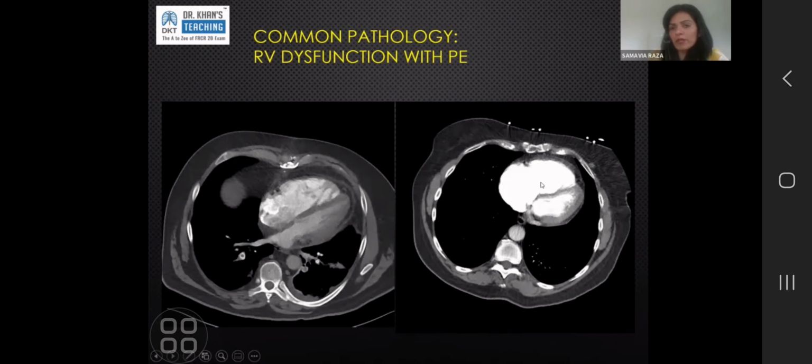Context is important about whether you can see a cause for that strain. That could be a chronic, CTEPH sort of situation, or it could be an acute pathology. If it's an acute pathology causing that much movement of the interventricular septum, it is life-threatening. It certainly warrants a phone call. It warrants a critical finding alert.